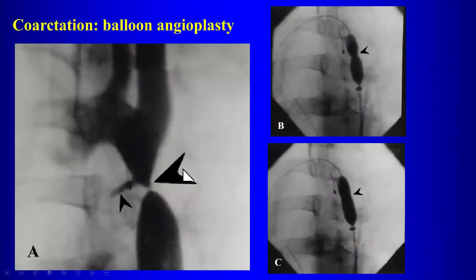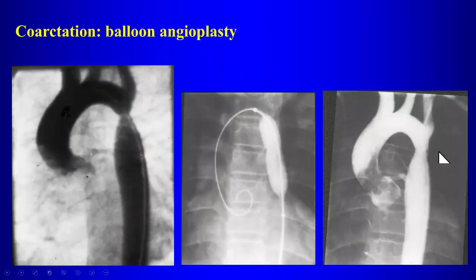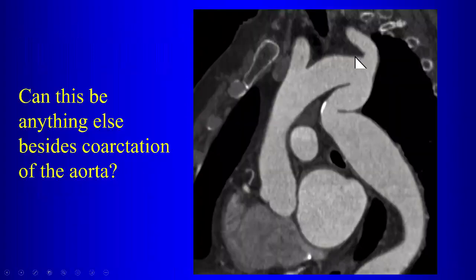Okay? Now, treatment of coarcs, they can be treated with balloon angioplasty. So here's an example. There's the coarc, balloon angioplasty. These patients require follow-up because the coarc can recur. They can develop pseudoaneurysms at the repair sites. So these patients do require follow-up imaging.